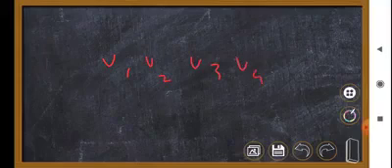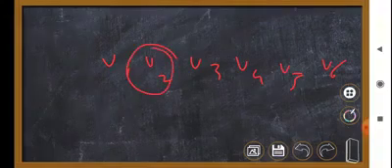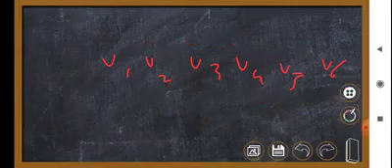Now coming again to precordial leads V1, V2, V3, V4, V5 and V6. V2 is almost just on top of the center of the heart, and V3 and V4 are almost on the interventricular septum, and V5 and V6 are more towards the apex of the heart. So gradually we see that the R wave is elongating, and this is also called the progression of the R wave.